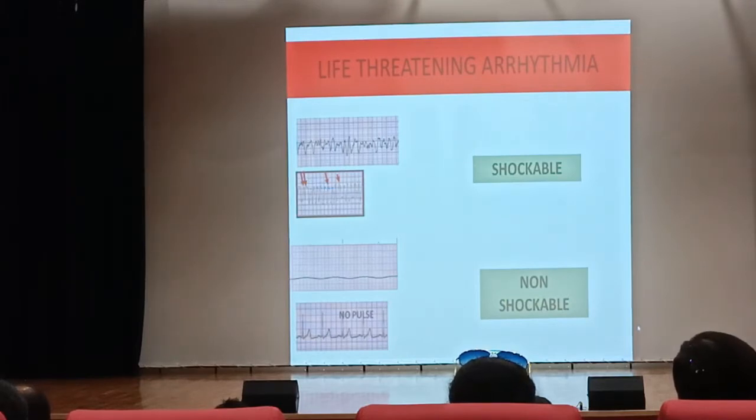Now, if I follow the steps of identifying an ECG, how can we label this? Anybody want to comment? No? Fine. If I look at this ECG, what could the rate be? Looking at these complexes, the rate must be 300 or more, maybe 500. I cannot calculate the rate.